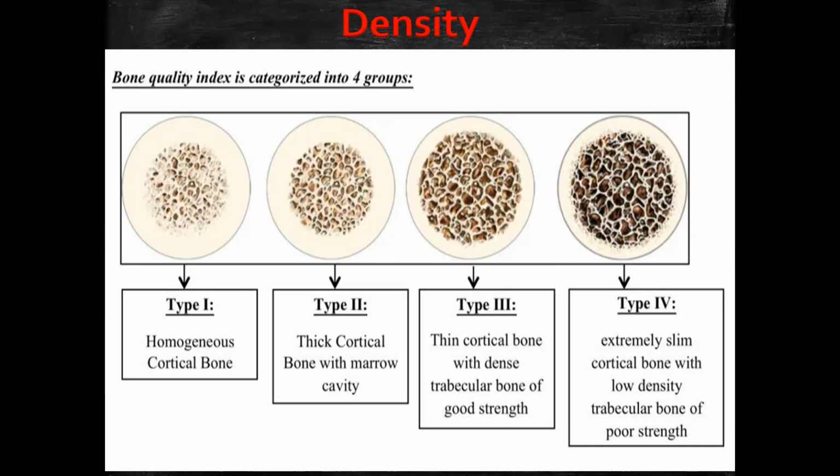Now, between this, there are trabecular patterns. The trabecular patterns are like nets, like our tennis rackets. And between the rackets, there will be marrow spaces. Marrow spaces are like empty spaces containing vasculature, so they appear black. Now you can just visualize that when more marrow spaces, the blackish part, appear, it will be more on the D3, D4 side. When it is more on the grayish white side with more cortical bone, then it will be D1, and in between would be D2. So this is how you need to visualize, comparing these images with a radiographic image.